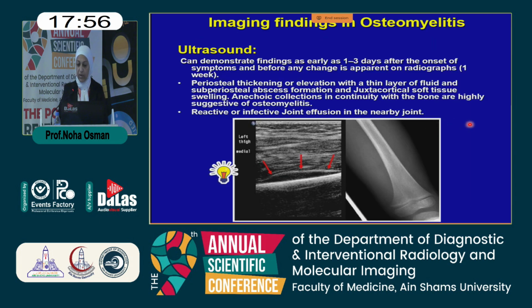Regarding the imaging findings in osteomyelitis, the ultrasound as a bedside test is very crucial in the first days before the onset of radiographic findings. The very pathognomonic sign in ultrasound examination is the periosteal elevation and the subperiosteal collection, which may be anechoic, meaning fluid, or echogenic, meaning pus collection. Also, we can see in ultrasound edema in the surrounding soft tissue.